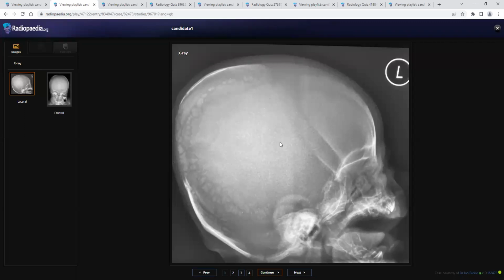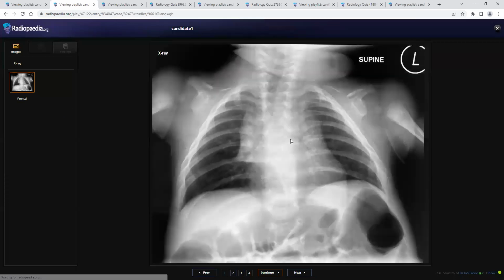There is widening of the fontanelles with much more of what they called small ossicles or Wormian bones. Increased Wormian bones. Yes, you are right. Okay. Good. You did well. This is a case of cleidocranial dysostosis, with absence of bilateral clavicles.